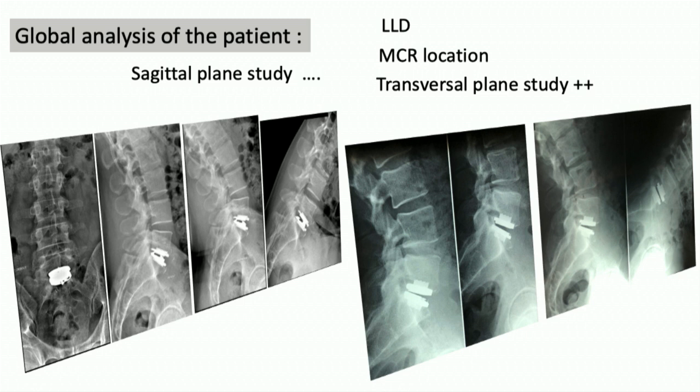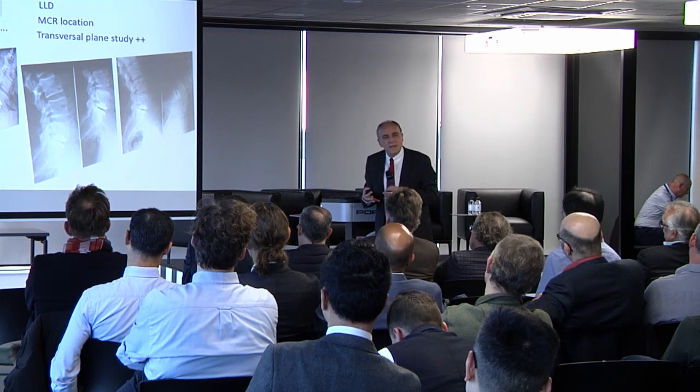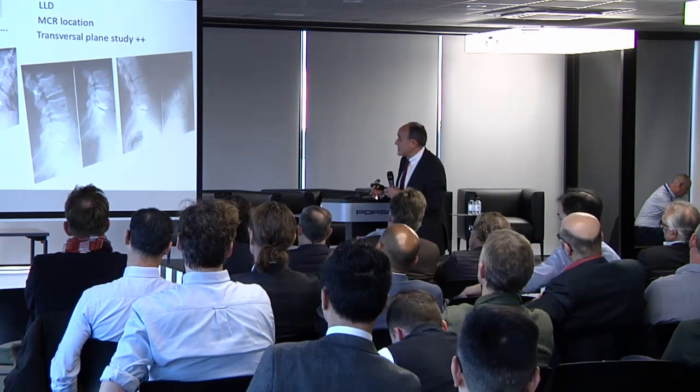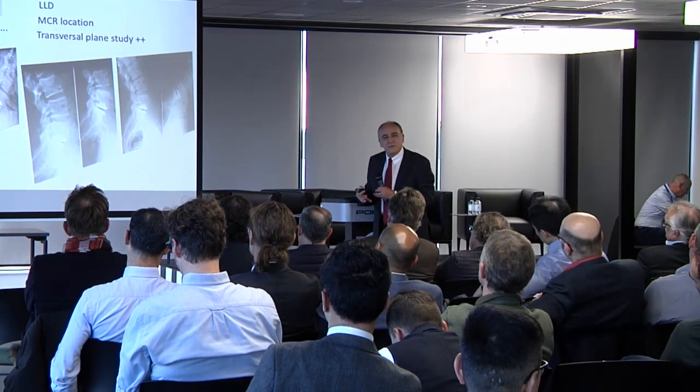We discussed a little bit at the cervical level the center of rotation. You have seen that we are able also to analyze the center of rotation at the lumbar level. But perhaps analyzing the transversal plane can be interesting. Now there are few papers with a vector of the vertebra for scoliosis, and perhaps, for the analysis of failed prosthesis, it can bring us very interesting information.